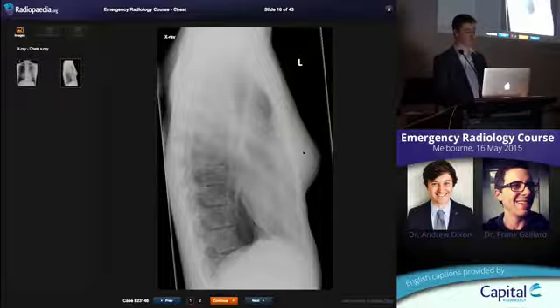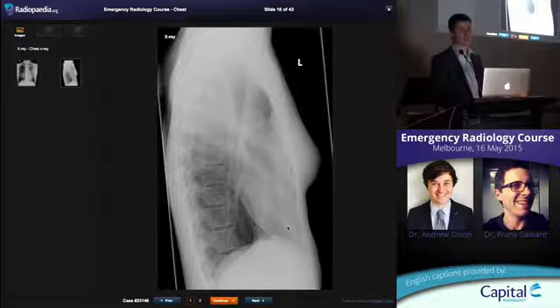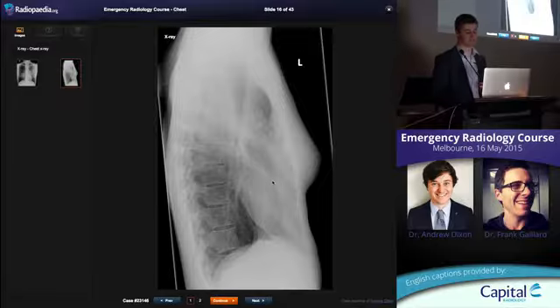Even though we had the lateral image for you guys to look at, vast majority of people said there was right middle lobe pneumonia in this patient. So don't forget to look at your lateral film and see if there's any consolidation in the right middle lobe, and also don't forget to assess the sternum on your lateral film to look for pectus excavatum.